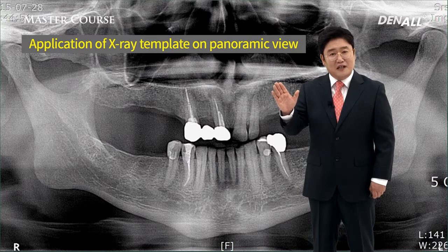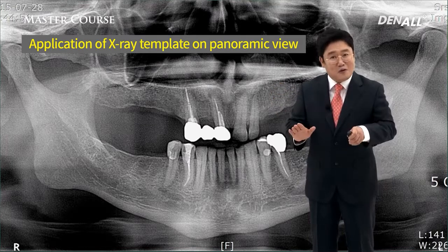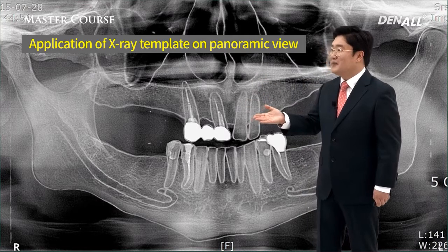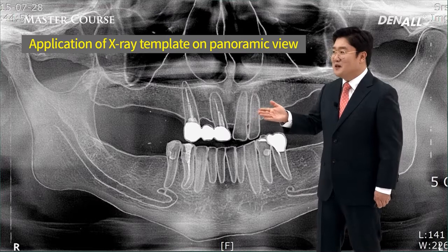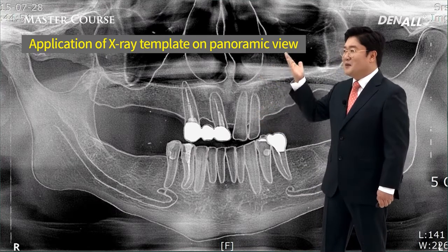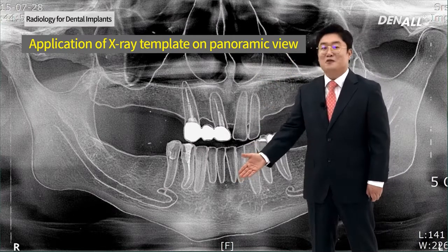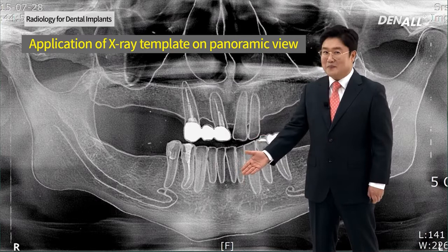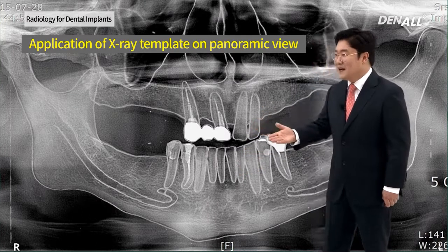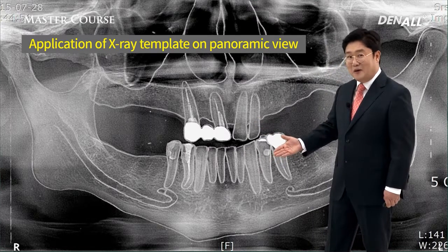After panorama is taken, the pictures are developed and transparent paper is put over it, and with sharp pencil, tracing is done. By tracing, we can identify teeth, bone, maxillary sinuses, and inferior alveolar nerve running canal. Not only that, the regions where implants will be placed, the bone height is measured.